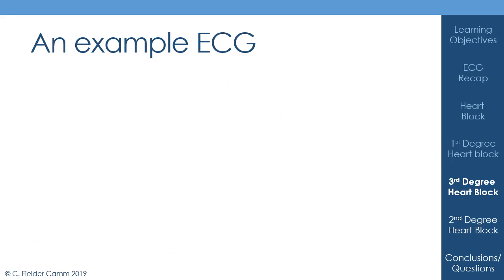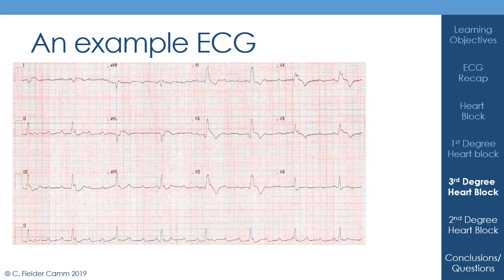Okay, so it seems like it's about time for an example ECG here. So as usual, I'll pop it up on the screen, give you a few seconds to pause it and go through it in your own time, and then I'll go through it with you. So here it is. All right, so hopefully you've had a chance to go through it.